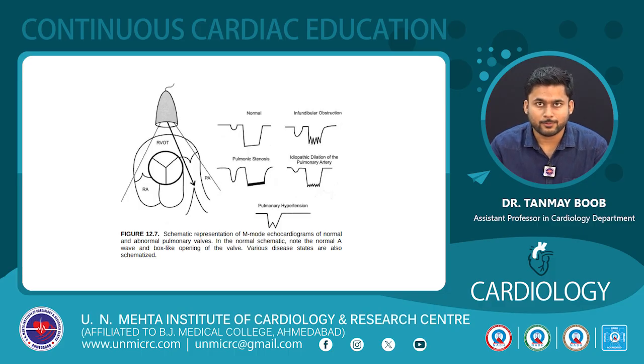If there is infundibular obstruction, there will be fluttering of the second wave as shown. If there is pulmonic stenosis, in the third image note the A wave is accentuated.